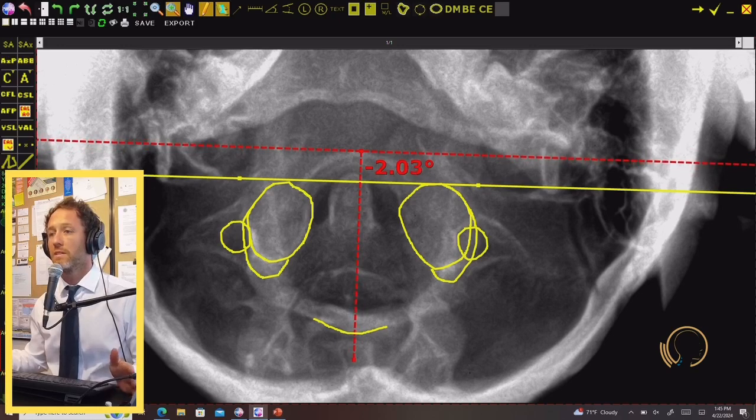To me, this is the least reliable one of these lines. But I feel good about that. I feel like we're right at that point. Right at that point there. Okay.